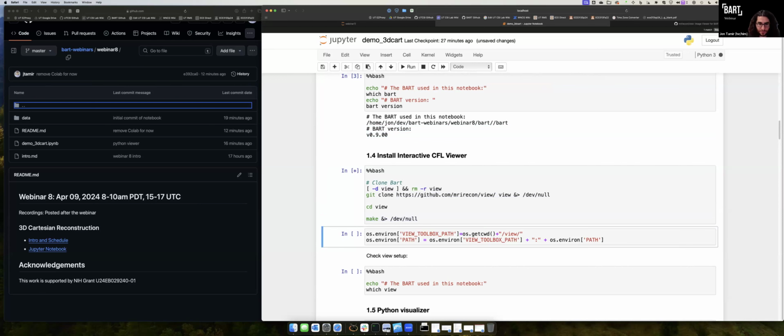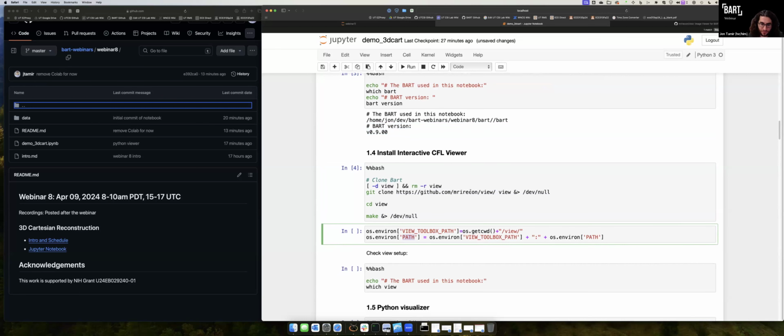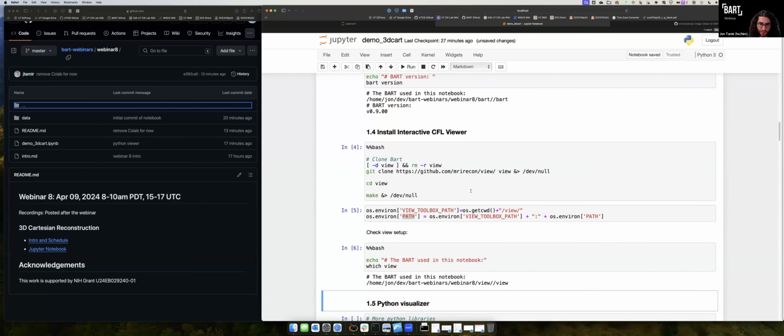I run this. And I also made a path for my viewer installation directory, and I'm adding it to my path so that I can easily use it in the rest of the demo. And I'll just check that it is indeed installed where I think it is. So the BART viewer used in this demo is also under my Webinar 8 folder.